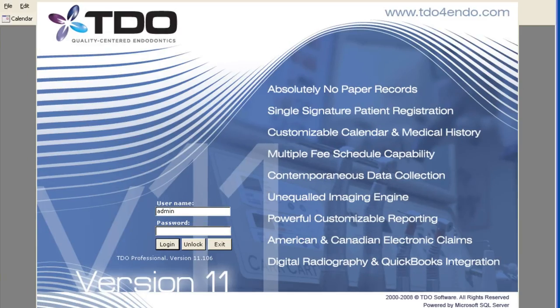We hope this tutorial gave you a good overview of setting up your Kodak CBCT integration.